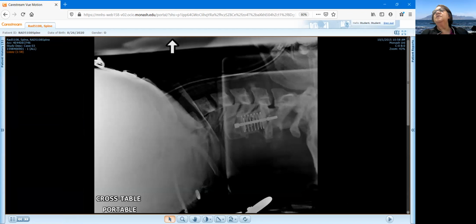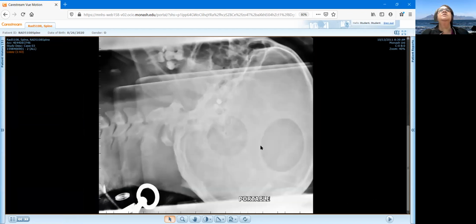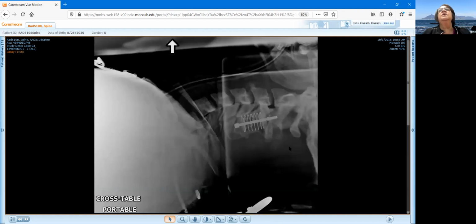So for case 3, I think there's another image as well. This is of the upper cervical spine, which doesn't capture quite well on the other image. You can see that this patient had a harness on. So the upper vertebrae are quite fine, there is nothing there.